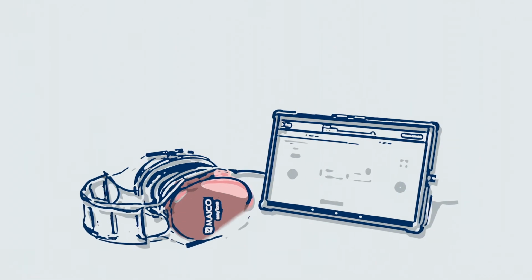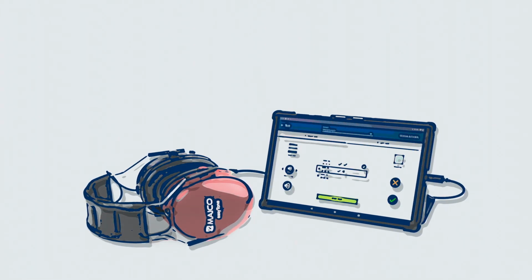This completes this tutorial on start screen options. Please continue through the tutorial series for additional easyTone instruction.